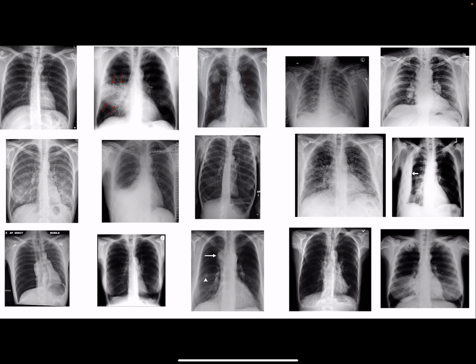All right, let's go and see if we can get all of these. First one's normal. I'll give you that one. Here we have lobar pneumonia. Here we have an adenocarcinoma or some sort of, you get points if you can just tell that it's a non-central lung cancer. Here we're going to see these hazy, blurry infiltrates. This is ARDS. Here we have the hilar lymphadenopathy.